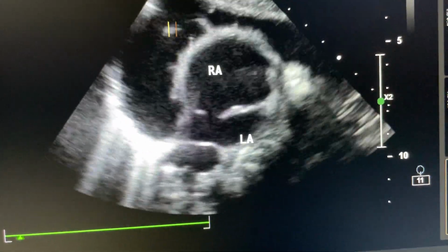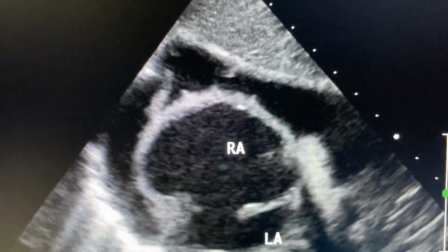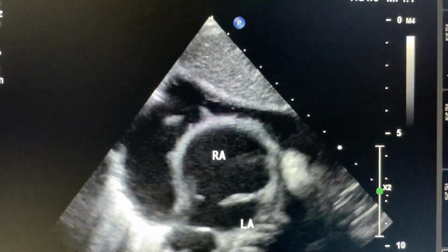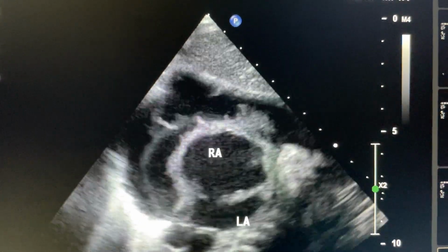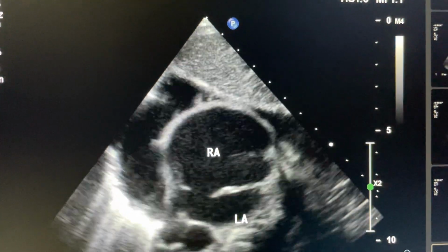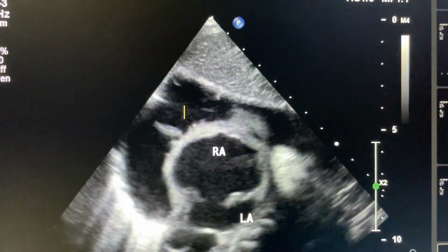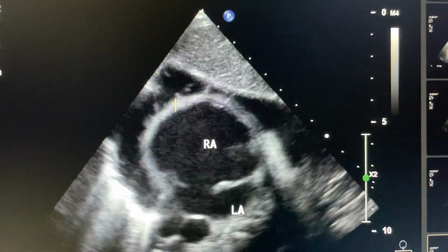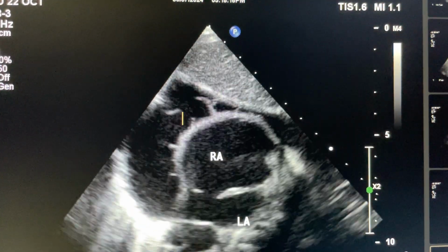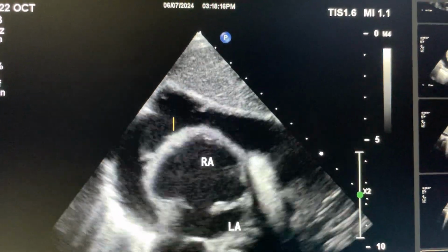This is pericardial effusion, and the effusion has a fibrin band. You can see fibrin bands, and fibrin bands indicate infective nature. In a developing country like India, the most likely diagnosis is tuberculosis. One can take a history of fever of long duration, which will give you findings in favor of tuberculosis. Sometimes viral infection can also cause a similar finding.